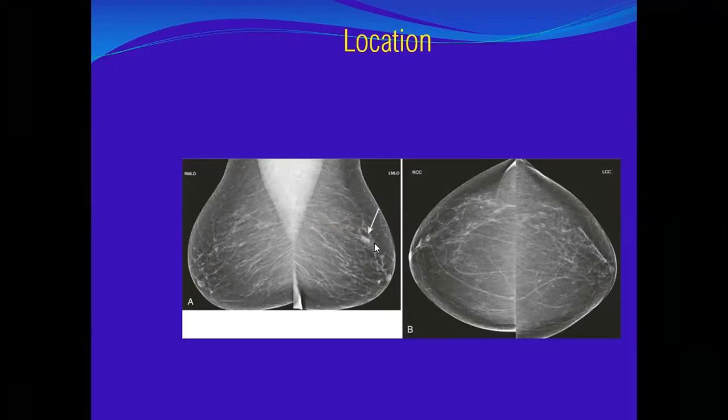So it's supposed to be included. It is not in the posterior breast, to say that it might be cut. Okay. So it's supposed to be within the included part of the breast.